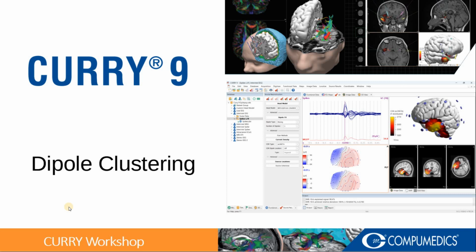In this short video, we will show how to perform dipole clustering. Firstly, we will use the automatic spike detection. After that, we will create a realistic boundary element model, and lastly, we will compute a dipole cluster.